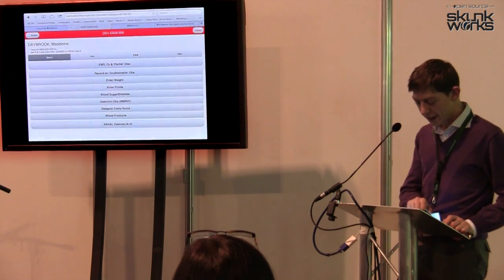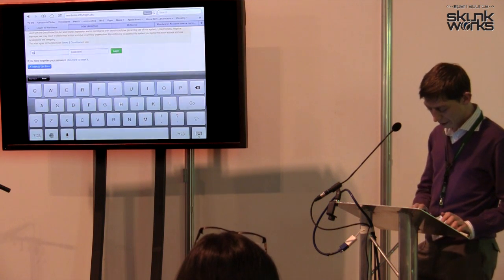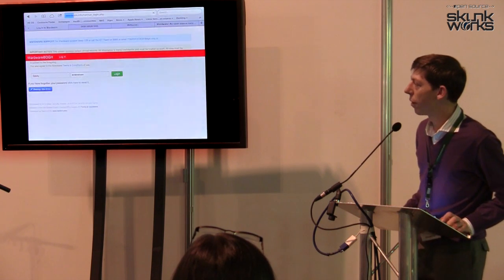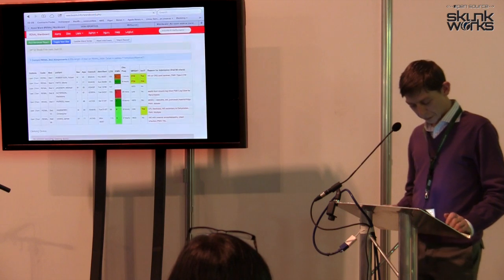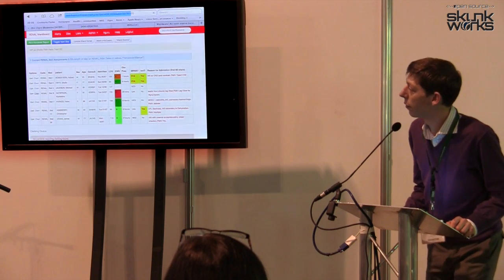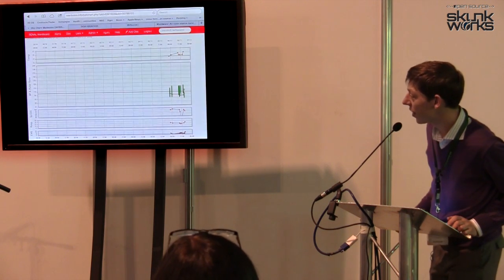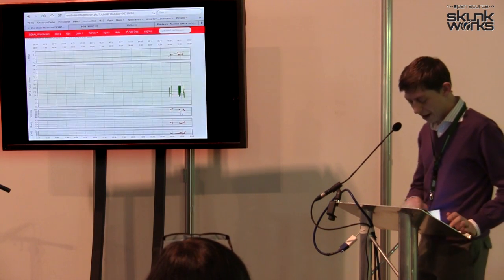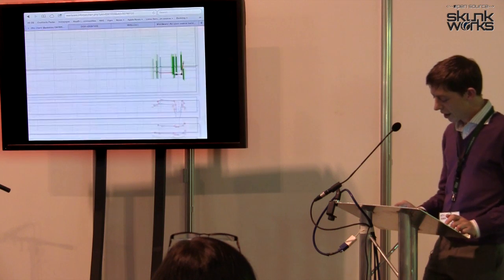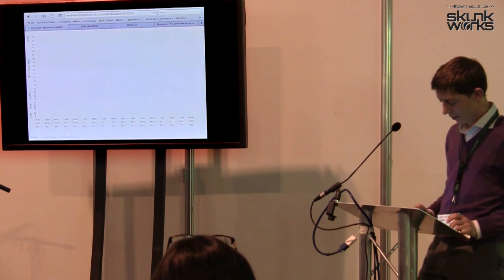So I'm just going to log into the desktop version, or rather the pad version, so we can see the obs chart as created from those observations and for this patient. So we're working with Madeline. I'll have a look at her chart. And as we can see, here have been our observations over the day, and we can track there the TPR chart for the temperature, the BP, blood oxygenation at the bottom. All of this is plotted. We can zoom into that information, see it in a bit more detail. We can zoom out again.